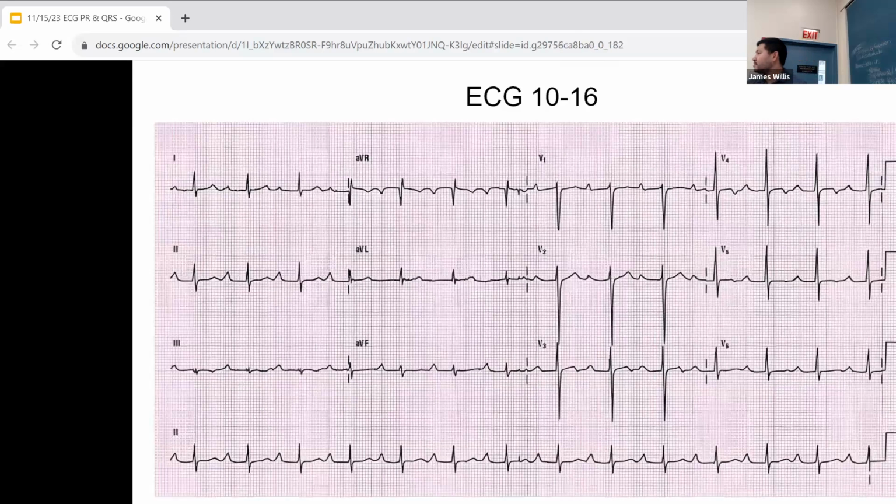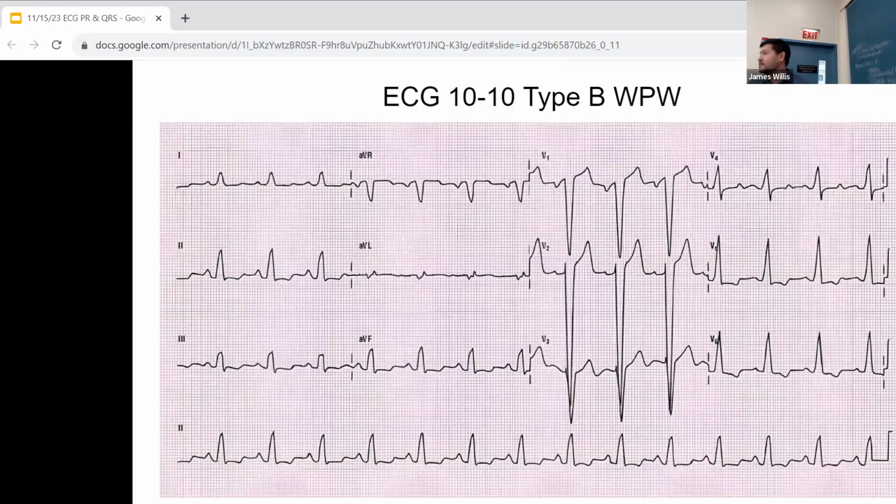The other thing, when you see that wide QRS, the other possibility would be LVH with what's called an IVCD. So you don't see a definite left bundle, but it's suggestive of it with LVH, and the QRS is a little bit slurred. Instead of calling it a left bundle branch block, they call it IVCD, intraventricular conduction defect. And it's common in people with really bad chronic hypertension.